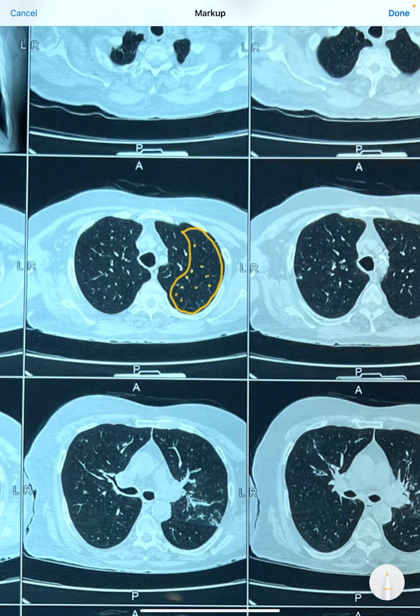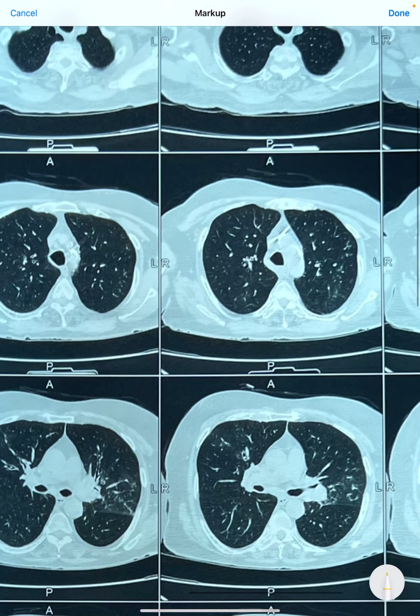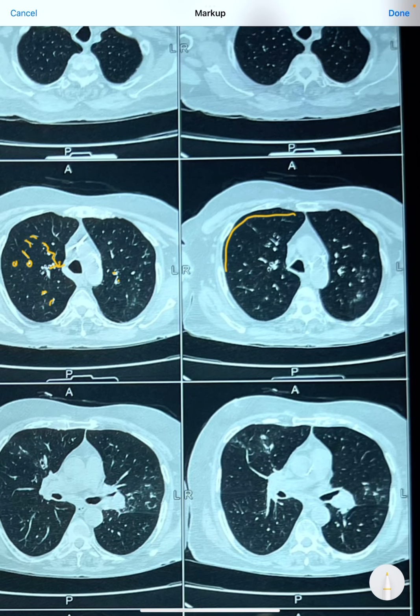So these are basically bronchovascular markings, which are a very typical normal structure present in both the lung fields, because there is division of all these bronchial arteries, bronchial vessels, bronchial veins, pulmonary veins. These are all the typical normal branching patterns in the bilateral lung fields. So here we can see that the miliary mottling is not at all there.